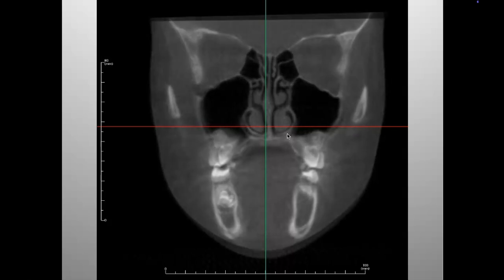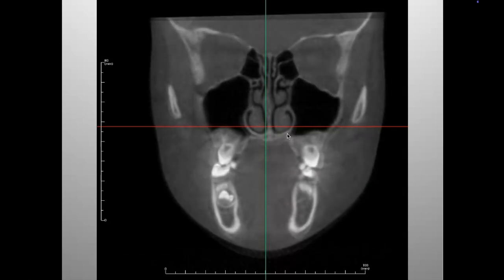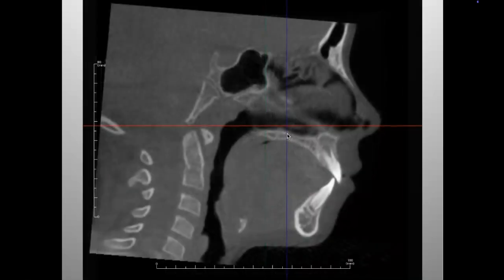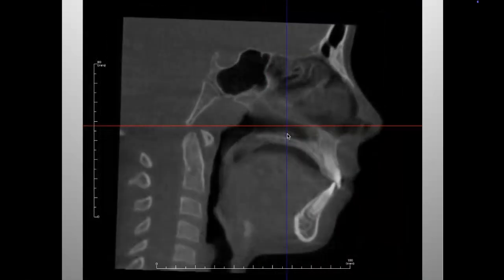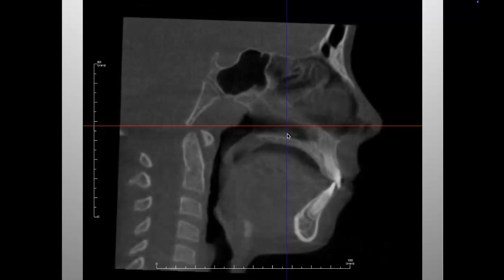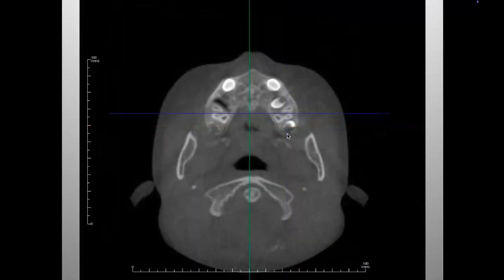So you can see here how far down the entire maxillary complex and nasomaxillary complex is coming with the result of the expansion. And then when we look here, you can see that as well, but not quite as much forward movement in her case, right? So pretty much more straight up and down in this case as far as the changes go. And then also in the smile, if you look back, you'll see that it increased her smile display as well, which adds up with the expansion that we achieved there.